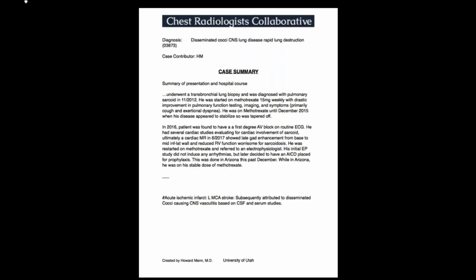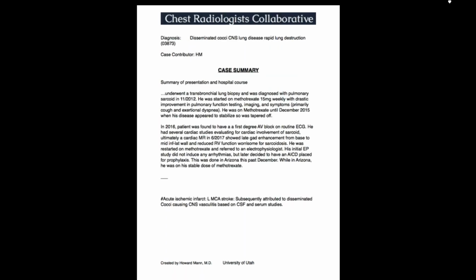And you can see that he had hyphae, diagnosed with eventual culture for cocci. So this is a crazy case of coccidioidomycosis involving the CNS as well as the lung. I don't think I've ever seen anything like that before. Wow. Everything else was negative in terms of infection.